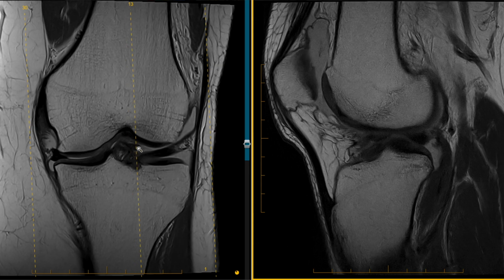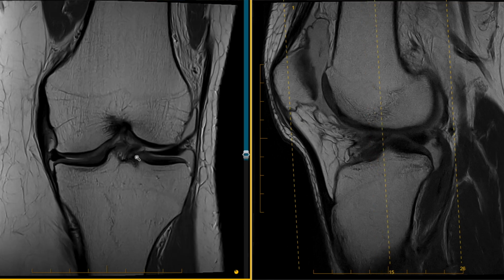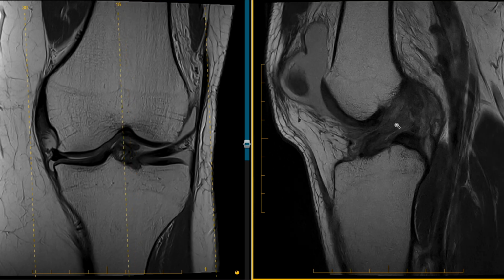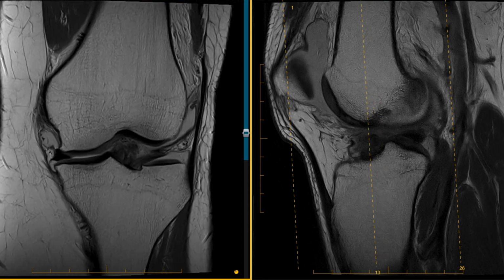as opposed to this case where you can see clearly that this represents displaced ACL tissue from the tibial sided fibers of the ACL beneath the lateral femoral condyle and superior to the anterior root attachment of the lateral meniscus. And this is it here on these sagittal sequences as the displaced tissue. And here is the ACL injury. So a case of a displaced ACL rupture versus that of a non-displaced ACL rupture.